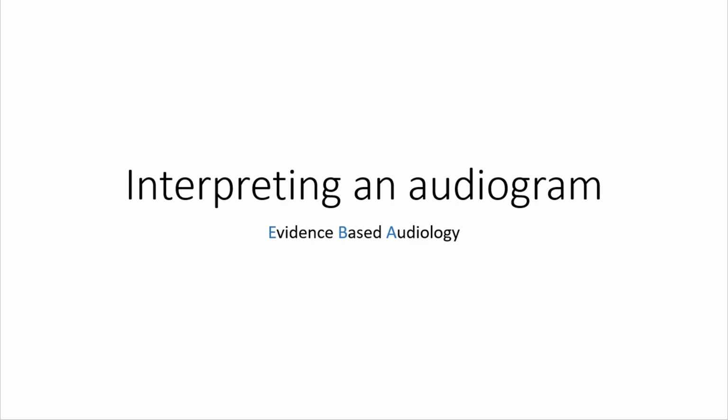Interpreting an audiogram. Audiologists describe, display and understand hearing loss using what's called an audiogram. It's essentially a visual representation of your hearing thresholds. Let's have a look at a few audiograms to get a better understanding of how to interpret them.